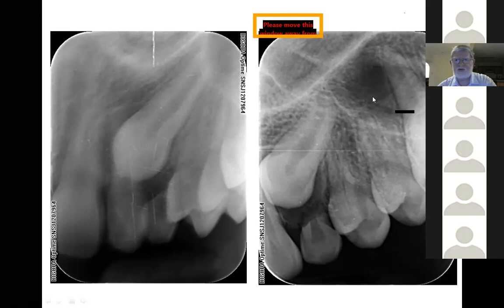Very good, very good. So we've gone on a tube shift. We've gone from this picture where the canine is sitting over the mesial of the tube. I've moved my tube across to the left, and we are now sitting, you can just barely see the tube. We can't see the central incisor. So we've done our tube shift. And is this tooth placed palatally or buccally?